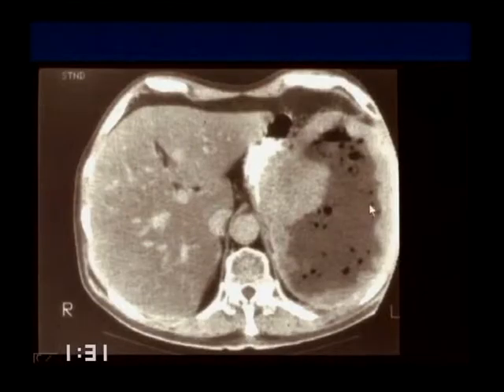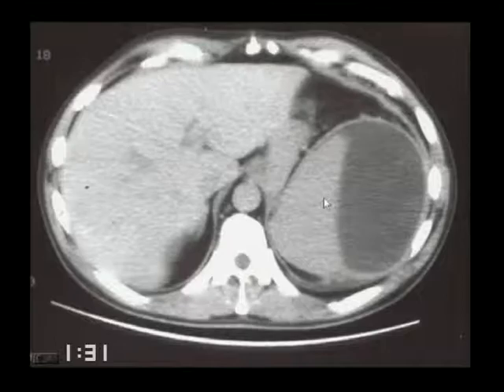I showed you I had no examples of gas due to infarction without infection. This is a lymphoma with necrosis, but it got superinfected with candida. And there's gas and fluid in the spleen. And then the last ones are unusual cases.